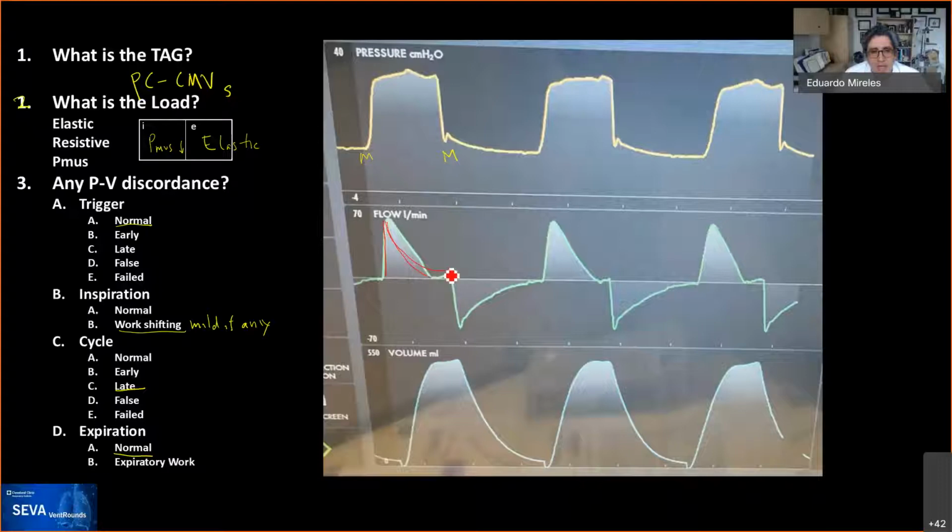It could also be that there is a leak, which can also give you an increase in the amount of flow getting out of the system. And that's a little bit tricky to catch. So there may be intratidal volume recruitment, or changes that change the compliance and resistance. Instead of having your nice, beautiful decay, you don't have it.